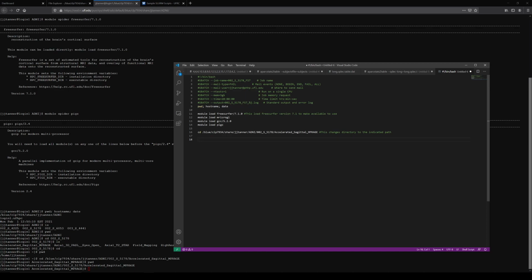Okay, so we've changed directory into there. Now what do we want to do? We're going to convert our file using DICOM to NIfTI. We had done this in the other video, and it's going to be the same process. So we're going to do dcm2niix, and then we're going to output the file name, and we want to call it this person's ID. So I'm going to copy their ID, and then add underscore T1W.nii. Well, actually, we don't even have to put the extension. And then dot is the current directory. That's what we had done before in the other video.